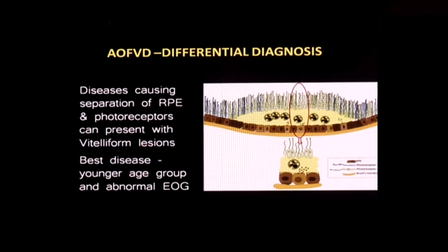As compared to the degenerative and dystrophic processes, you just have a collection of material, and this material is the outer segments, lipofuscin, melanin, macrophages, and RPE cells. And this is what gives you that homogeneous, dense, dome-shaped elevation. Subsequent to that, there is actually atrophy or loss of the photoreceptors. And because of loss of photoreceptors, the remaining material is now phagocytosed and removed by the RPE cells. And therefore, you see an apparent clearing of the material.